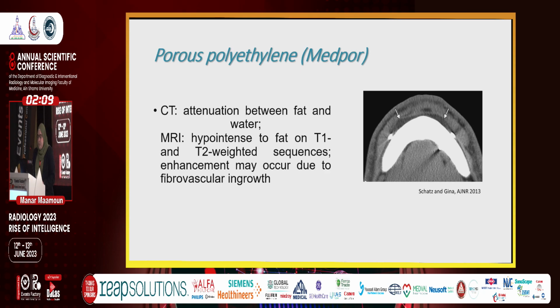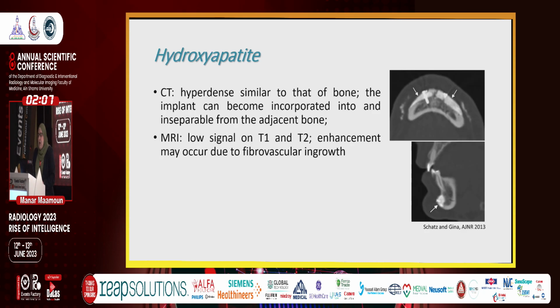Another implant is called Medpore. Hydroxyapatite implants are similar in density to bone cortex, usually incorporated and inseparable from the adjacent bone. On MRI, they show a very low signal on T1 and T2 weighted images, yet you can see enhancement because they allow ingrowth of fibrovascular structure.